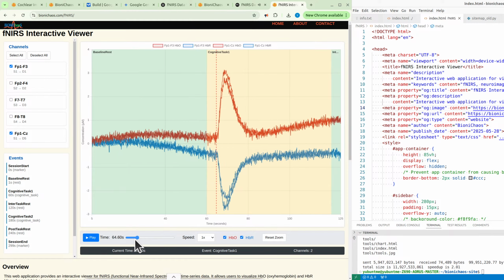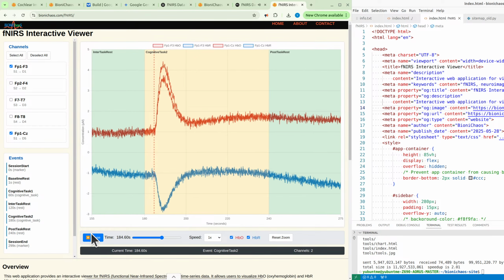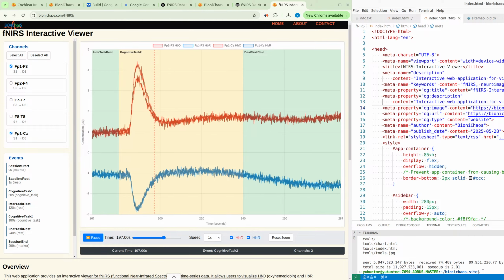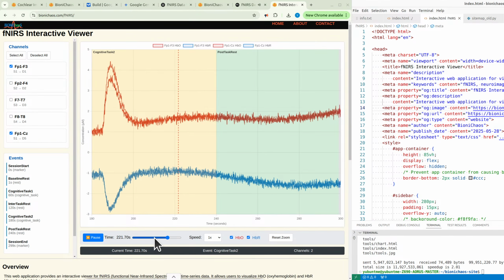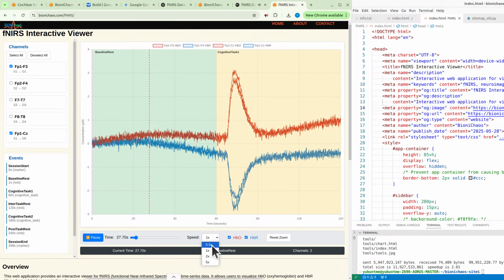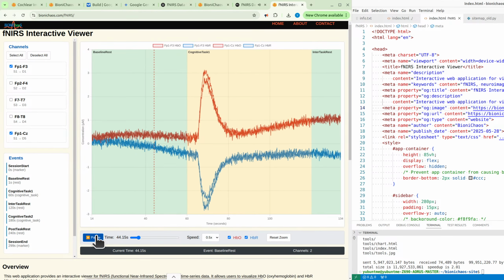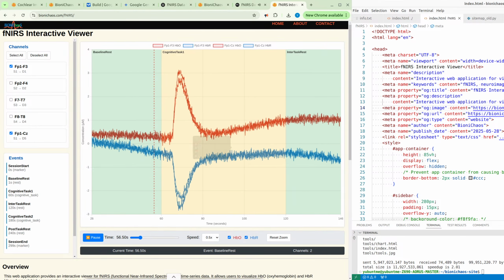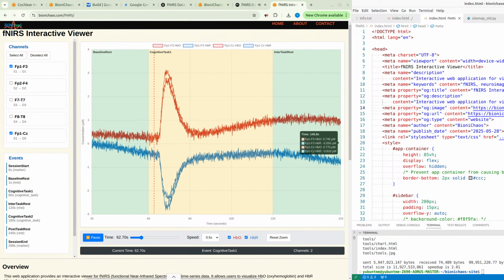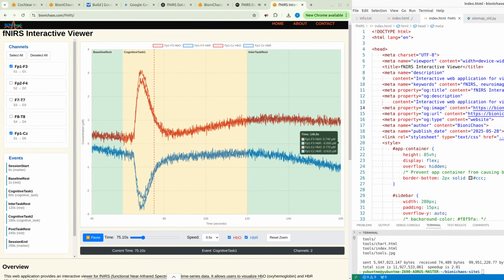So on the surface, it looks like a pretty useful tool for researchers to see where and when brain activity is supposedly happening. You see those HbO lines generally go up during tasks, HbR goes down. Yeah, the classic hemodynamic response pattern. Increased oxygenated blood to active areas. The tool's description even mentions how these peaks and dips clearly highlight brain activation. Okay, but that's where our critique source comes in. It looks textbook perfect, maybe too perfect. Is it realistic? What does an expert eye actually pick up on here?